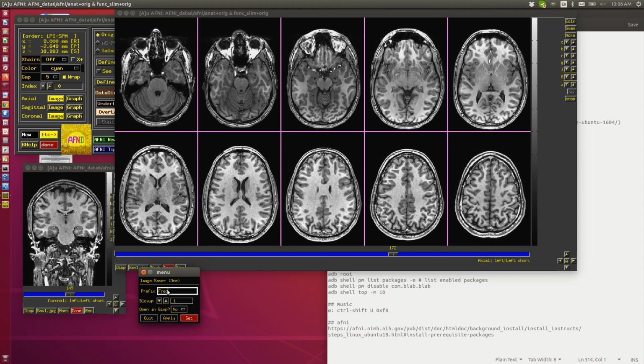And then there's a blow-up button here. I can have it magnified inside the program by a factor of 1, 2, 3, and so on, because these are actually relatively small for the purposes of printing or something like that. Of course, you can always blow it up inside another program too. So it all depends on how you're going to deal with the image later, right?